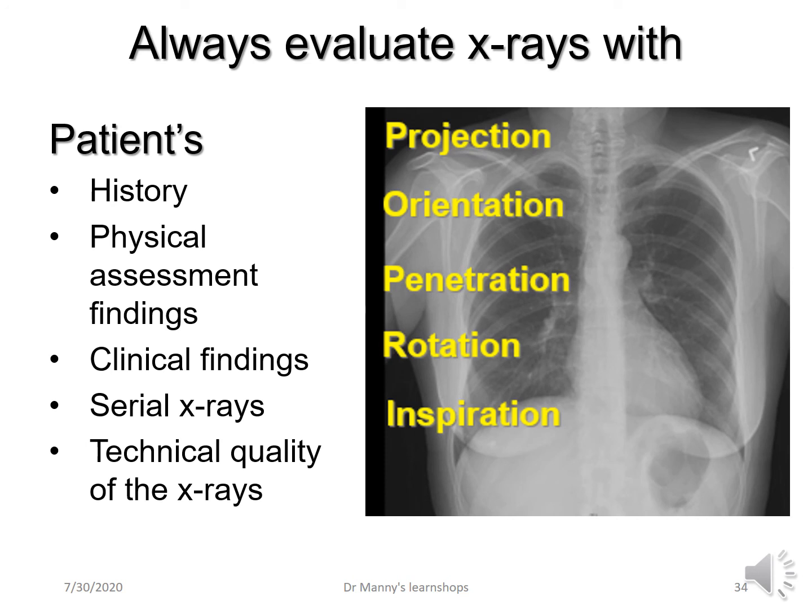When you've got situations like Dextrocardia, make sure that the radiographer has labelled the X-ray correctly, that says this is the right side, this is the left side, especially when the heart position has been reversed, because sometimes they make mistakes as well. Everybody's human.